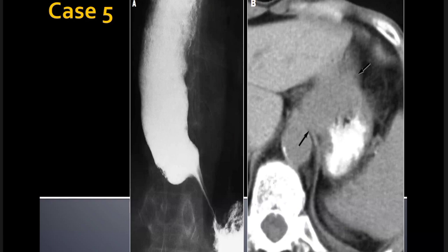So it's interesting, isn't it? It's a very good case. I like this case because it illustrates that sometimes you can't be 100% certain that there isn't an underlying malignancy there. And as you quite rightly stated at the beginning, this person would need endoscopy, just to make double sure that that isn't the case.